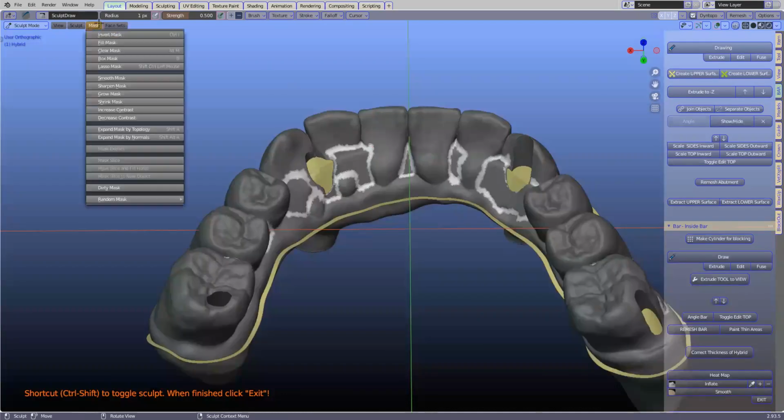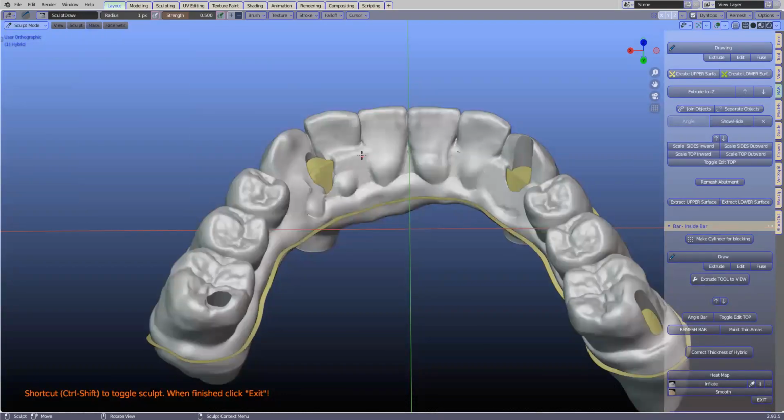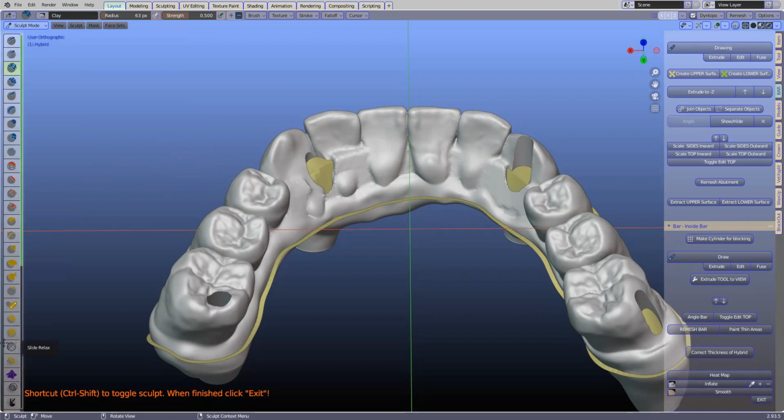And this thing I've got to get rid of, clear mask. So smoothing is done with protection. What is the protected zone at the moment? Is it the entire fitting surface underneath? No, actually, at this stage, I don't think anything is protected. But I would have to get back to you with that one, Wolfgang.